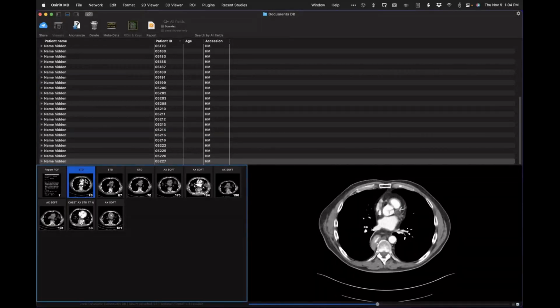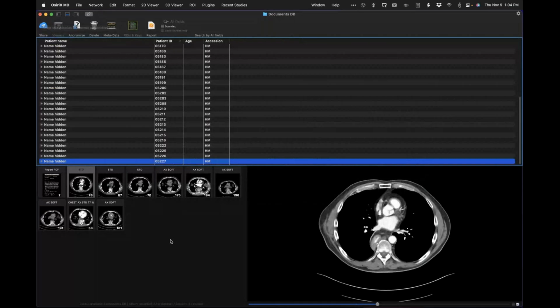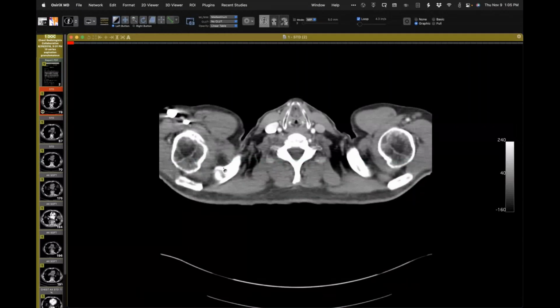All right, here is a patient. This is a really nice case that shows, I believe, I don't see your screen yet, Howard. Okay, let me see if I can go back and... I'm able to see your CT now. Good. Okay, nice.